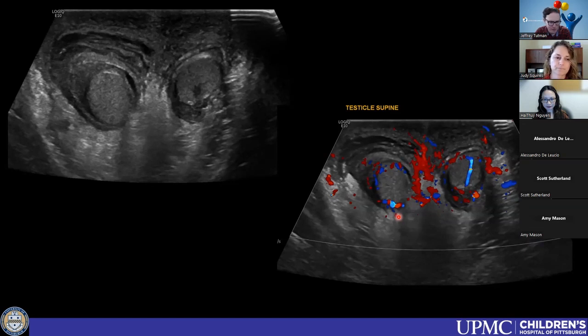Judy, do you have any other comments on this particular case? No, yeah, this is one of those where the imaging findings are much more striking than what the patient presents with. Clinically, I think it can also be scary looking, very red, but the patient doesn't have as much pain as you would expect with cellulitis. But again, the clinical history is key in this situation too, which we don't always have. Right. Hopefully eventually you get some history to make those diagnoses.